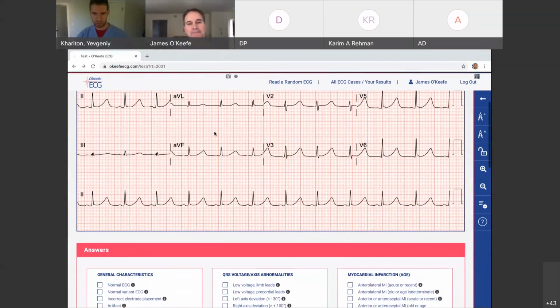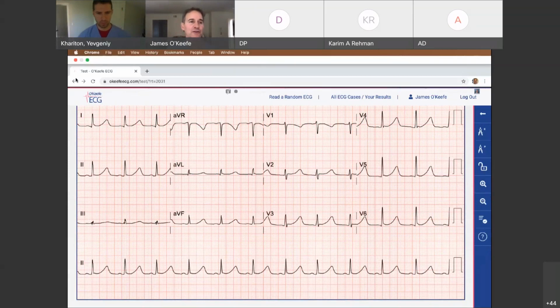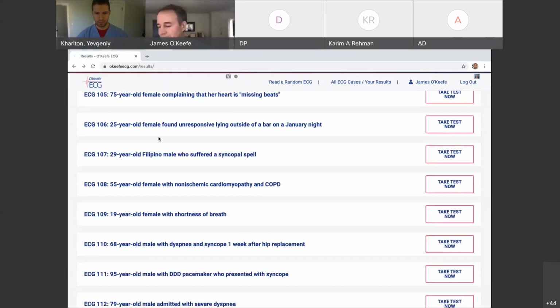But the cool thing is, like with this one, you warm them up, and there you can see, as their temperature rises, their ECG goes right back to normal. And a place where you might see this frequently these days is when we do the hypothermic protocols after cardiac arrest. So keep an eye out for that tracing.